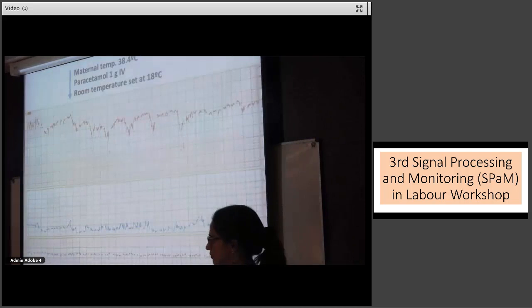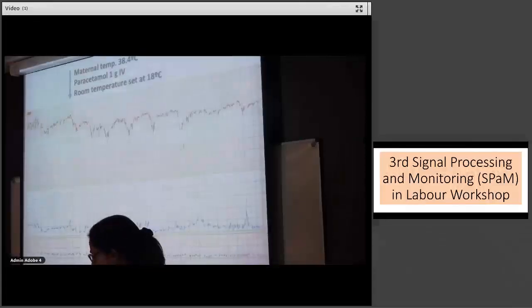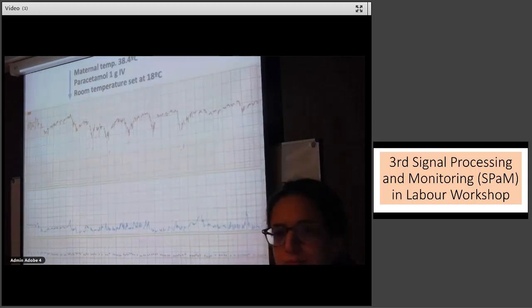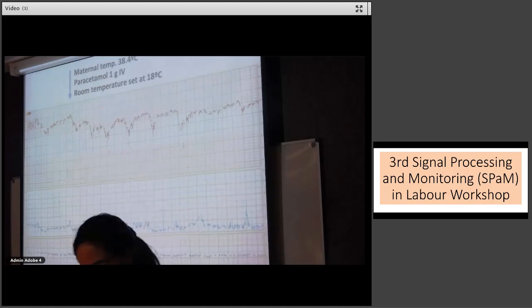Is the rate higher than it was at the onset? Yeah, because it was completely normal tracing and then signal loss, and so it was totally normal tracings before, except for the last part of the previous tracing that led to the internal monitoring. I have to say that those decelerations are not deep and vigorous enough for me to think that they were the ones that provoked the baseline tachycardia. So I will look for the causation somewhere else. The decelerations are new.